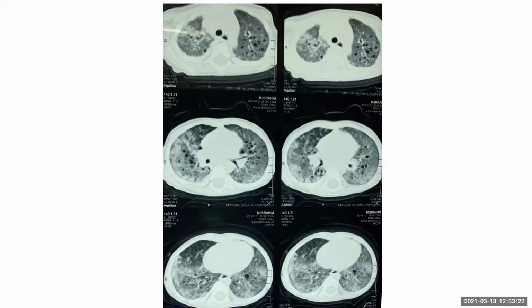I cannot clearly appreciate any other abnormality. What cystic lung diseases do you know of in children? There could be a CPAM, cystic, as well as others. At this time, I cannot clearly say. Okay, we'll come back to it, right? Yes. We go to the next one. Your description was very right.